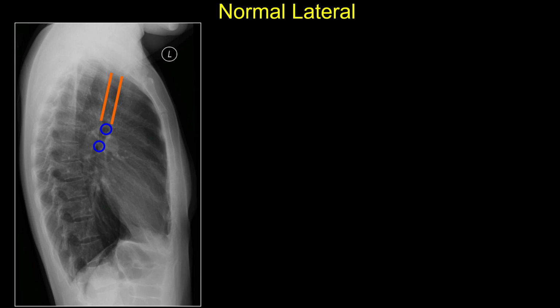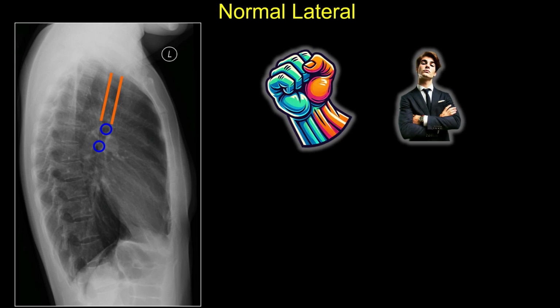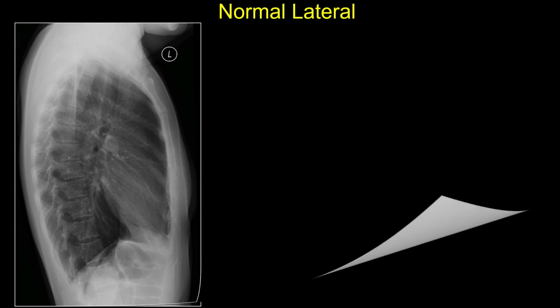The circle below is the left upper lobe bronchus. To apply the concepts that we talked about, remember that the right side, or the self-righteous people, are more superior and think they're on top of the world and they're better than others. So right upper lobe bronchus is superior.